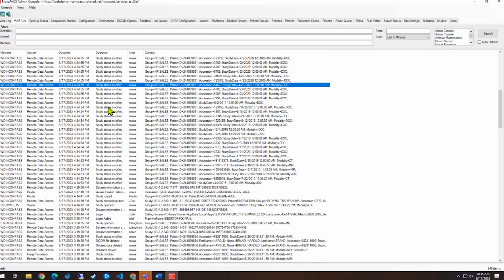And then if you open it in, say, Microsoft Excel, if you guys prefer that program, or any spreadsheeting program, it'll let you filter out those tab delimited columns. And then you can look at this and you can manipulate it in Excel, depending on what you guys are trying to accomplish with the data.